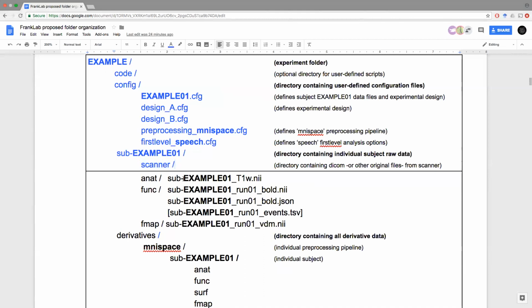There is one thing that is automatically copied by the pipeline. When you import the data, and you are pointing to a FreeSurfer generated structural file, in addition to the anat and func folders, it will also create one folder that is called surf, and will contain a copy of the minimal subset of files that it needs to be able to use the FreeSurfer information.